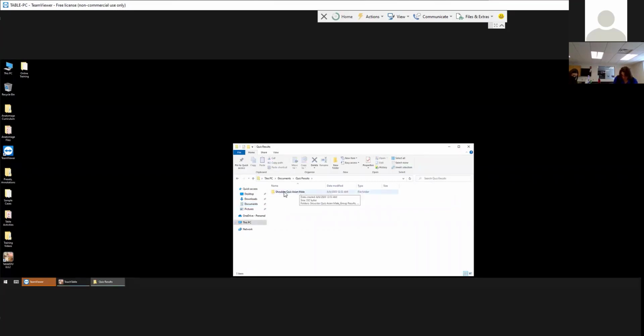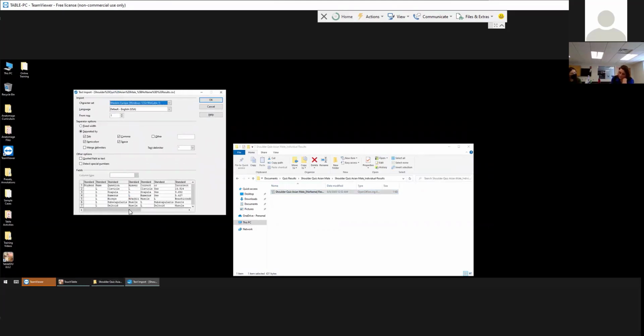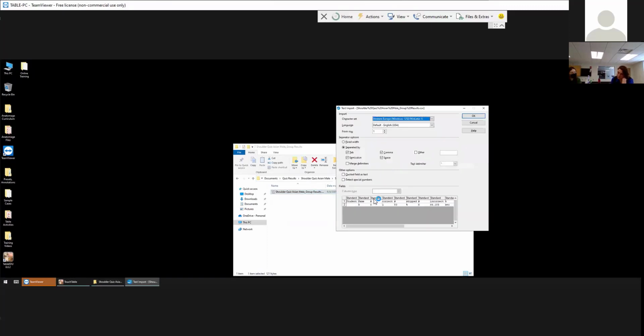And you can see this is the name of the quiz. And you'll get group results. So if you have multiple students who take it, it'll give you the results of the whole group, or it'll have your individual results. So here, for example, I just took this quiz. It'll make this Excel type file of everything I answered, what the question was, if I got it right or wrong. All that information backs up. So you'll have to just make sure students input their names, or you can load up names.